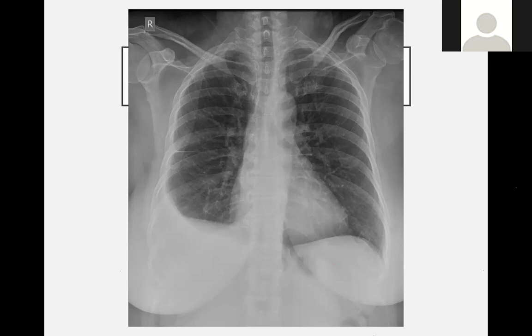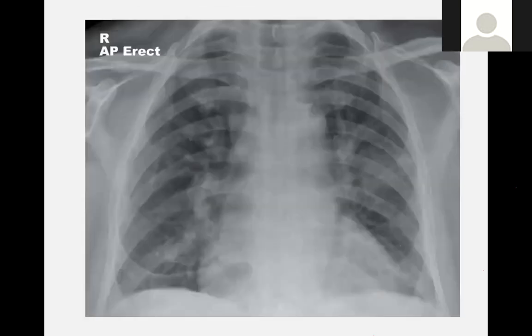Maybe this is normal, maybe just normal hilar tissue. I don't know. But it's got very prominent lung markings throughout the whole lungs. Okay, in terms of cardiac, you can't assess the cardiomediastinal width or breadth because it's an AP X-ray, so I can't really assess that.